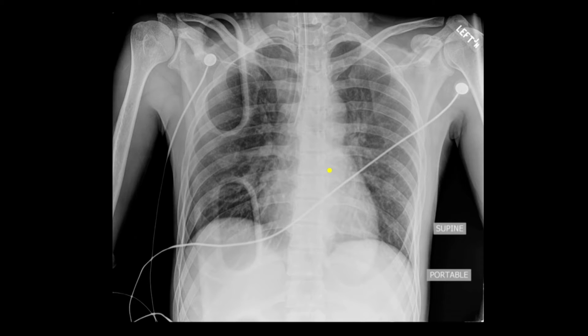And in this patient, the patient is on a trauma board. You can recognise the trauma board that the patient is lying on. Patient has an endotracheal tube, and the tip should normally be 2 to 5 centimetres above the carina, and the carina is here, and so you can see that this endotracheal tube is actually directed into the right mainstem bronchus, and so obviously that position is not satisfactory and would need to be withdrawn. Fantastic.